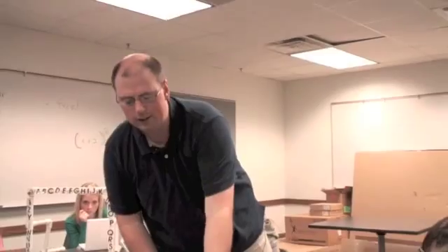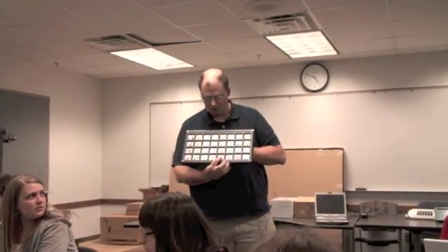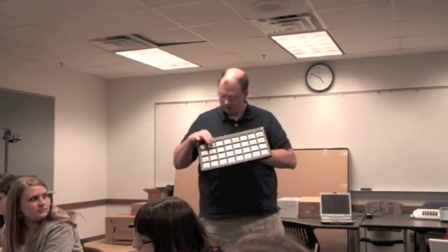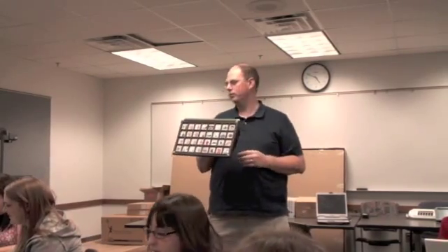And then we can really get to making choices. And this is one of my favorite communication devices. This is called a 32-message communicator. Boy, do I want to hear this. I feel content. I would like some animal crackers, please.